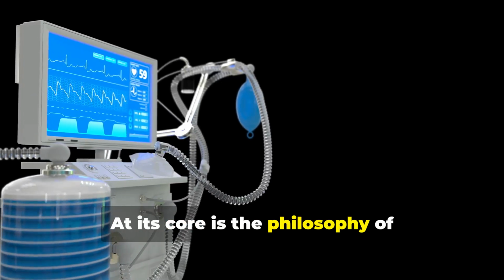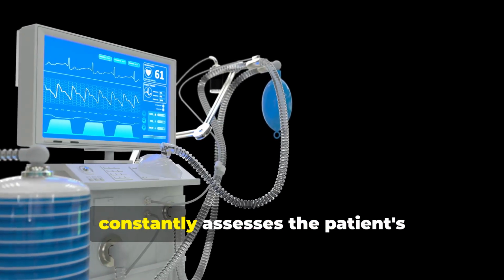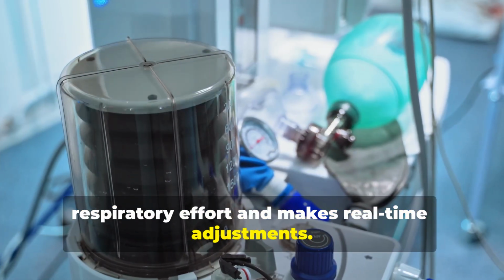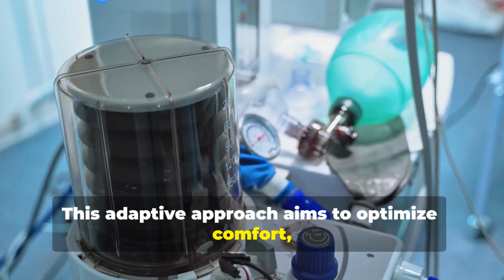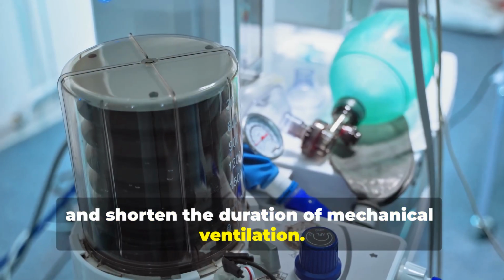At its core is the philosophy of intelligent ventilation. The G5 constantly assesses the patient's respiratory effort and makes real-time adjustments. This adaptive approach aims to optimize comfort, improve safety, and shorten the duration of mechanical ventilation.